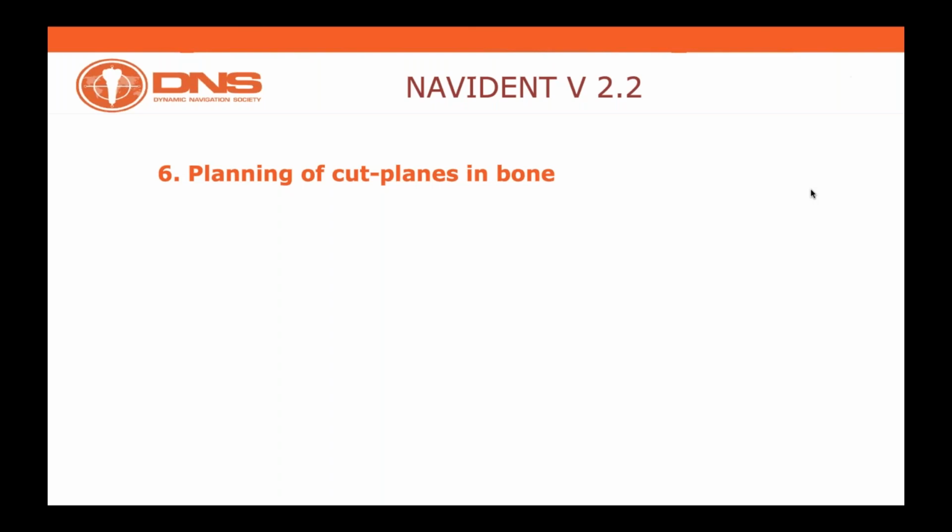The question is whether it will be possible to import an STL file generated by scanning implant scan bodies, after the scan has been processed by the lab and the virtual implant analogs added, into Evalunav using surface scan meshing, but also seeing if you can assess the position of placed implants without having to take a second CBCT scan.